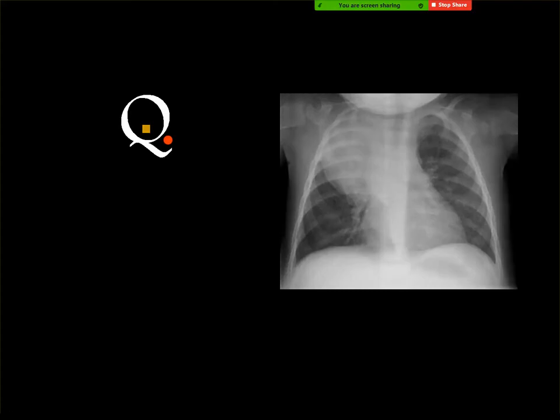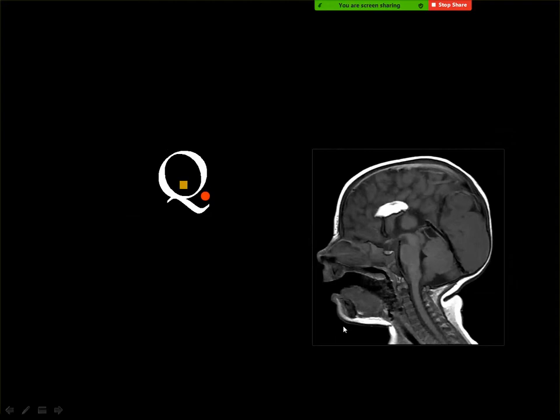Medulloblastoma. Neuroblastoma. Very good. Whenever you see a mass in the chest of a child, you think first of neuroblastoma. And you know the relation between neuroblastoma and age. You may remember that neuroblastoma occurs up to the age of 3. From 3 to 10, you consider the more mature form, ganglioneuroblastoma. And after the age of 10, you consider ganglioneuroma, which is a mature form. Okay.